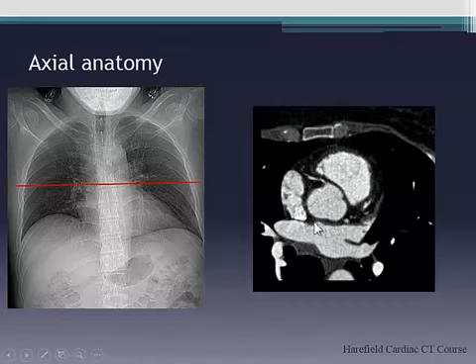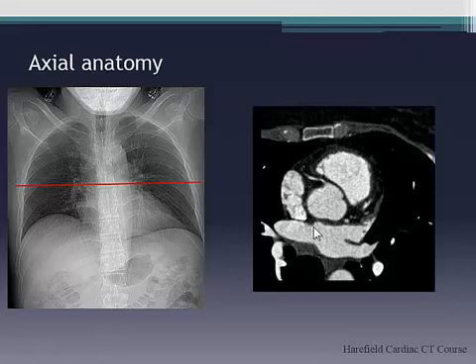You often see these diverticula, so these aren't necessarily pathological. In fact, they're normal variants. But it's good to familiarize yourself with the normal variants, because sometimes you'll be asked by one of your colleagues, oh, I've seen this on echo, what do you think? And if you're not used to looking at these structures, you'll find it difficult to say whether it's normal or abnormal. So try to develop a bank of what normal should look like, because it's extremely helpful.